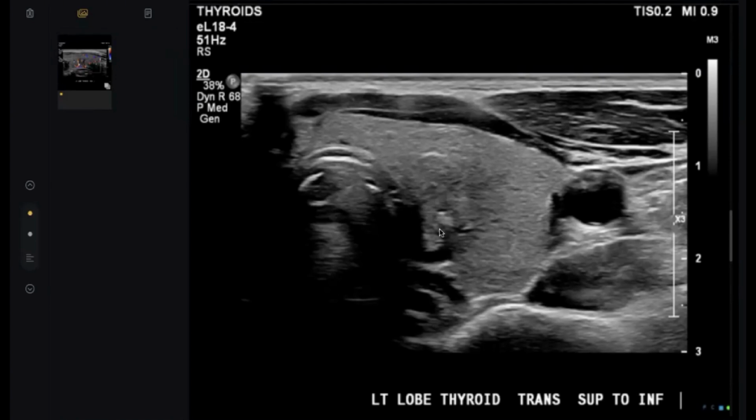The medullary one is the one most highly associated with calcification, but it is rare. Its percentage among thyroid cancers is very low. The papillary one, due to its high prevalence, becomes the more common cause of a calcified lymph node. Thank you so much. Next candidate.